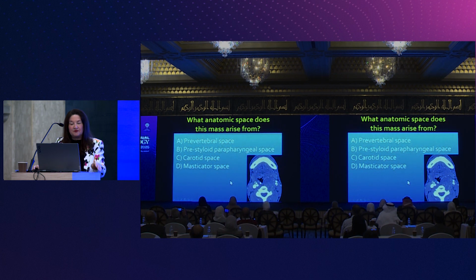What space is this in? Prevertebral, prestyloid, carotid, or masticator? How many people say A? B? C? Okay, good. D. So the correct answer here is prevertebral, and this is really the answer.